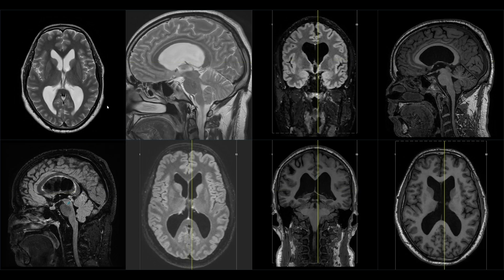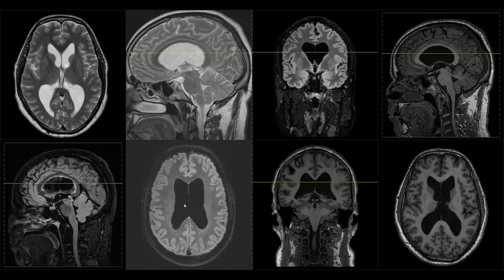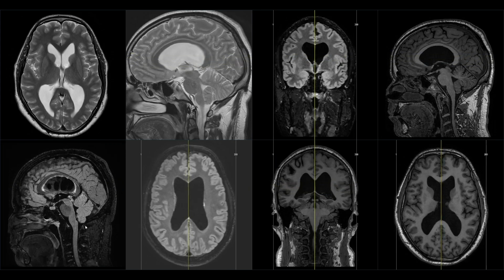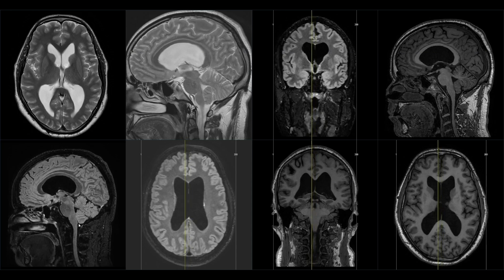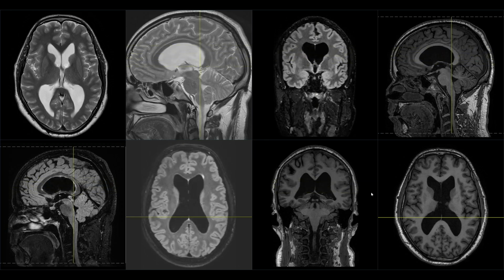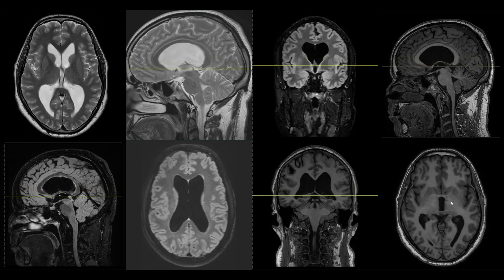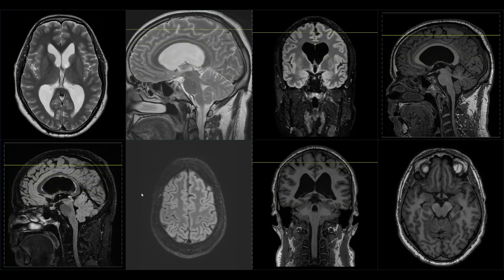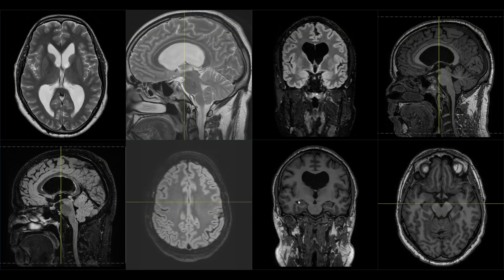So here is the case of a 50-year-old man who was investigated with MR due to problems with balance and vision problems and general tiredness. We have discovered that the ventricle system is widened supratentorially with Evans index calculated to 0.36. The sulci are reported normal and the temporal horns are not widened.